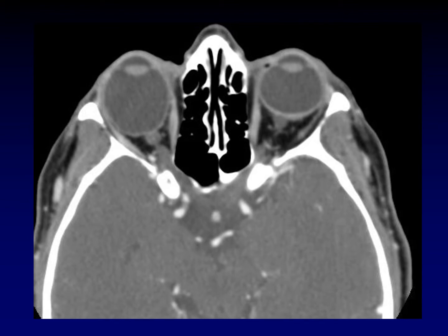This is an example of a staphyloma. And it brings up a really important general point when we're imaging the globe. The globe is a sphere. If you ignore the anterior chamber, it should be perfectly round. We're going to keep coming back to that concept. Now look at the affected eye and look how elongated it is in the anterior posterior dimension. This is not shaped like a sphere. This is shaped like a grape.